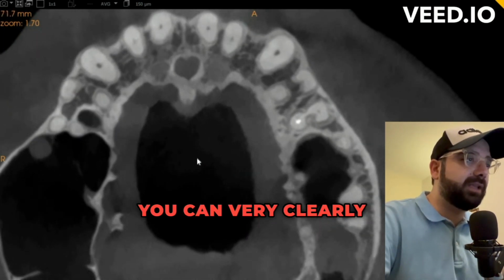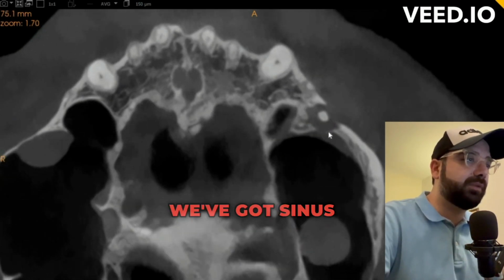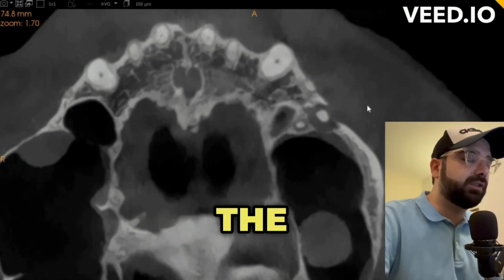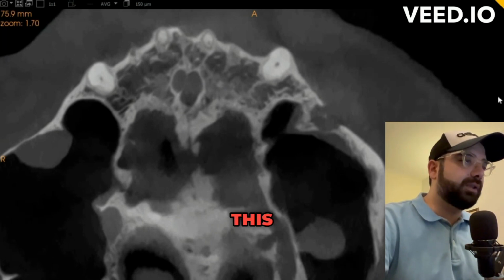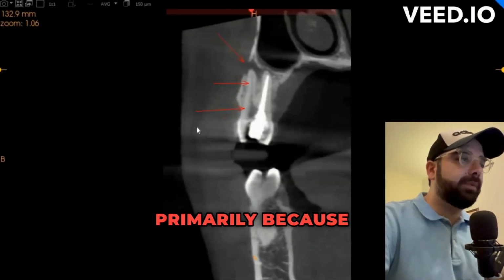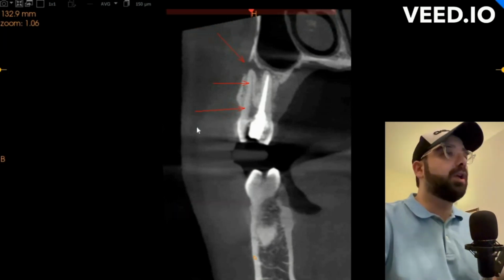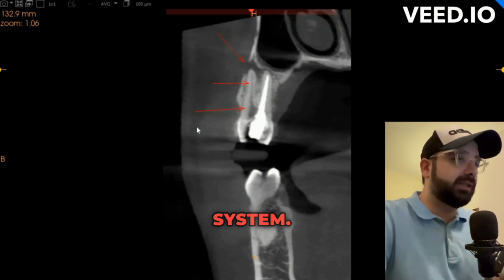You can very clearly see going all the way down, the root separates. This is where the infection is. We've got sinus involvement as well. We've got perforation of the buccal cortical plate. So a lot of things happening for this patient, primarily because of either lack of imaging on the previous dentist's part, or poor instrumentation, or poor knowledge of the root canal system.